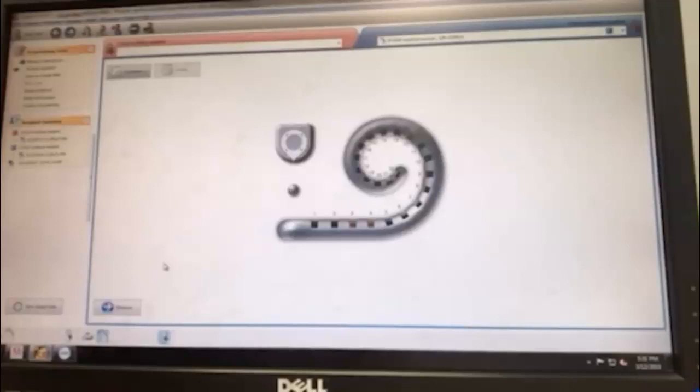Okay, in this video, you'll see some cochlear implant programming software. I'll stop it as we go through it to provide a little more detail about what they're talking about. But this is what audiologists do when they're setting what we call the MAP of the cochlear implant program.